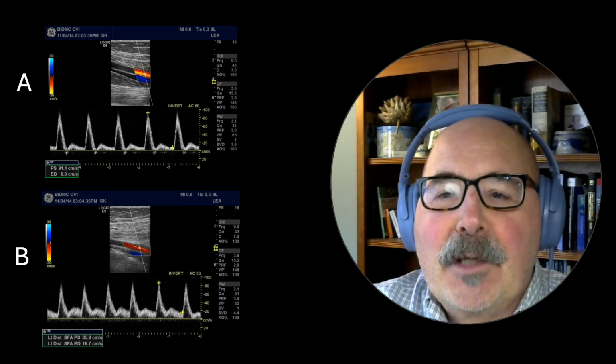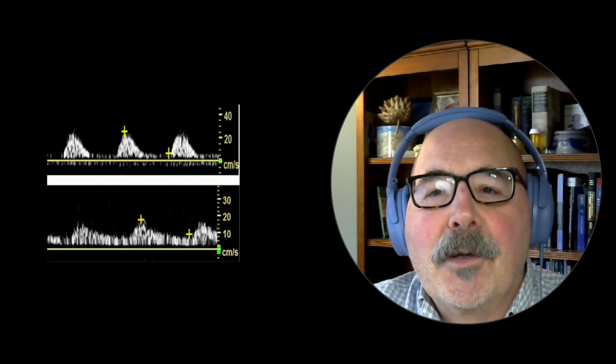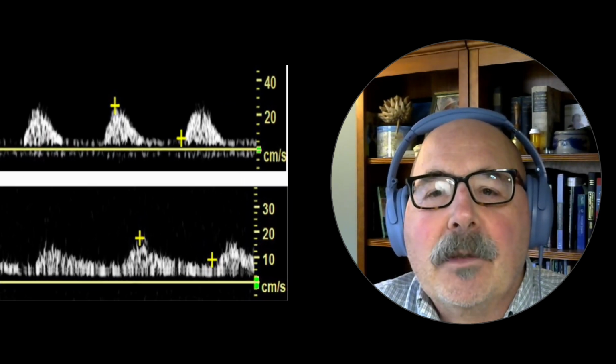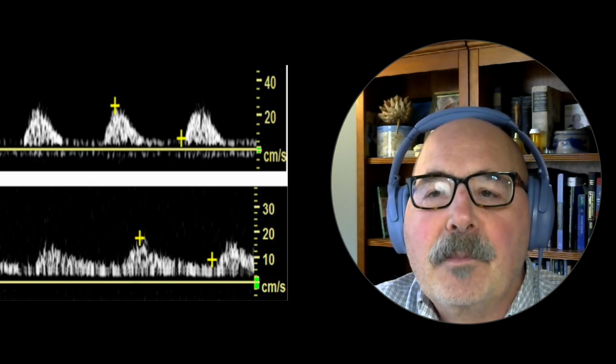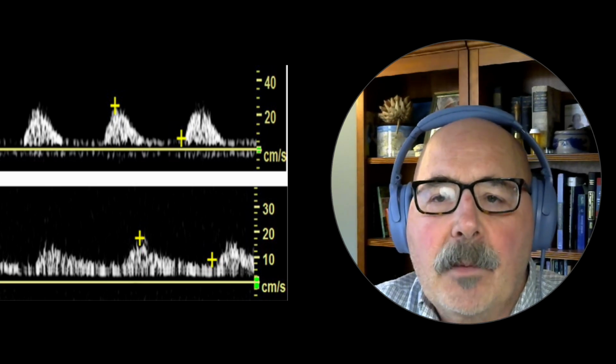Does it herald an ischemic limb? Hardly. Here are two other examples of monophasic waveforms. There's no denying something abnormal here. These both have low velocities, prolonged systolic rise, and spectral broadening. Some people call these waveforms tardus and parvus, from the Latin for late and small. One could also describe them as dampened.